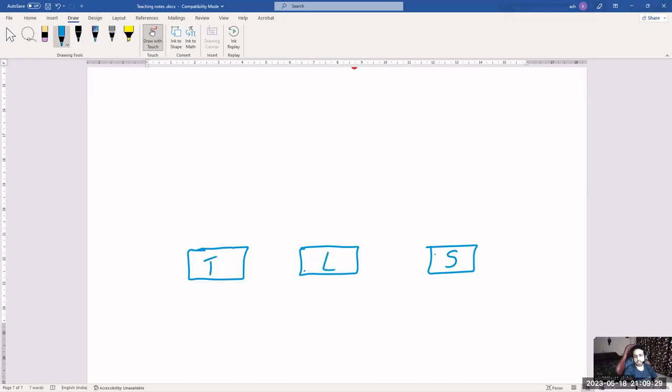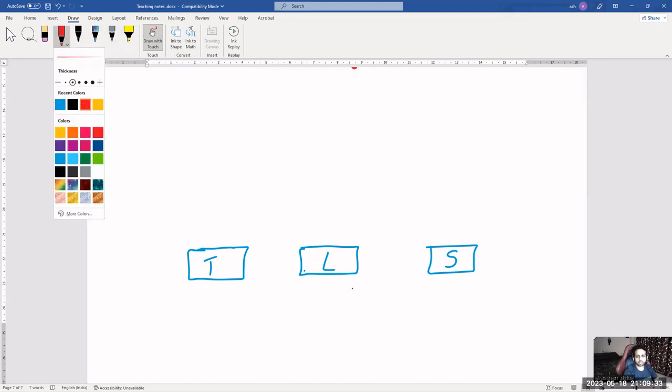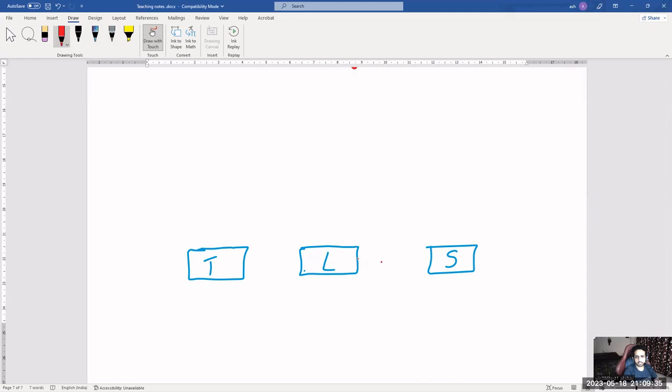Okay, and between the scaphoid and the lunate, as you know, there's a ligament connecting these two. They keep them in position, which is the scapholunate ligament.